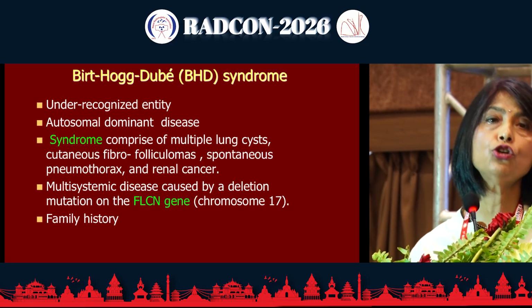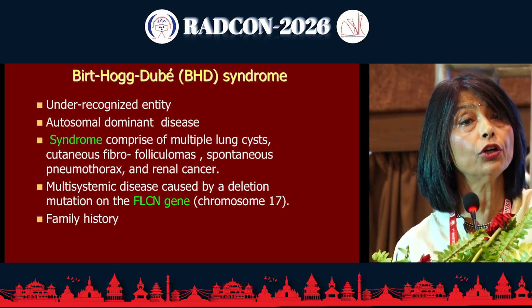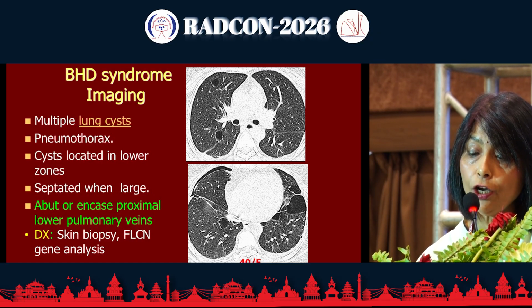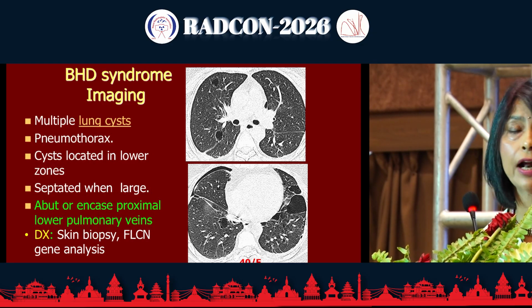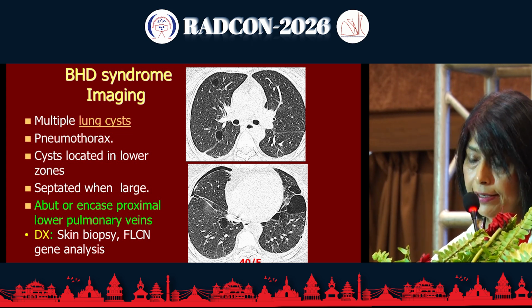So two were neoplasm. This is an inherited disorder. LAM also had an inherited disorder, tuberous sclerosis. This is specifically due to a gene deficiency. It is very oblong, these are the key words here, cysts encase or run parallel to pulmonary veins in the lower lobes. These ovoid-looking lesions are diagnostic.